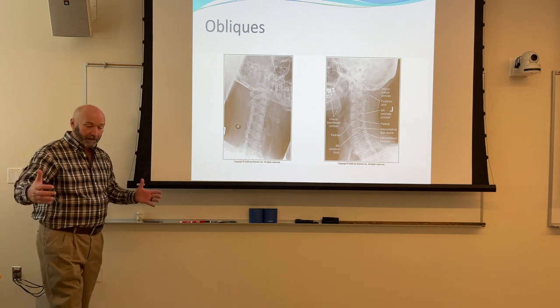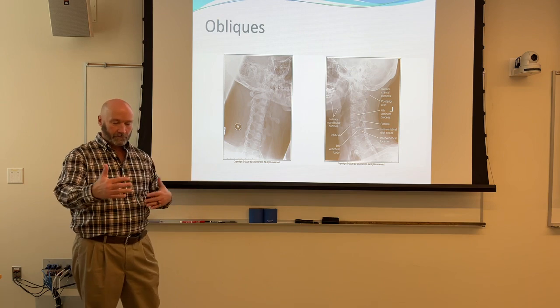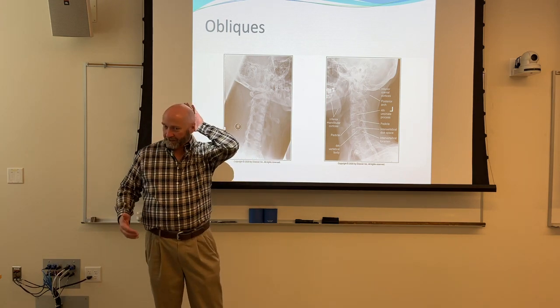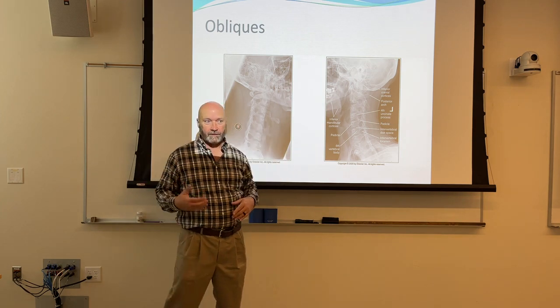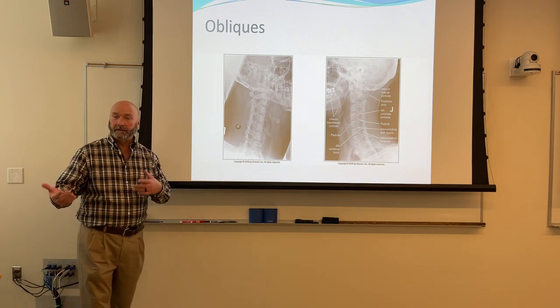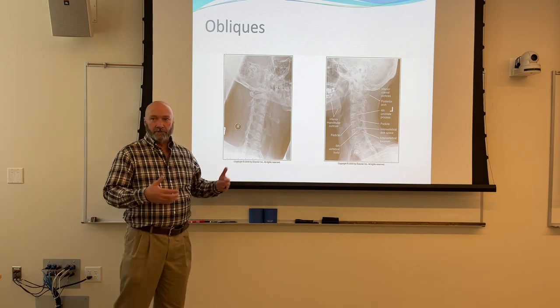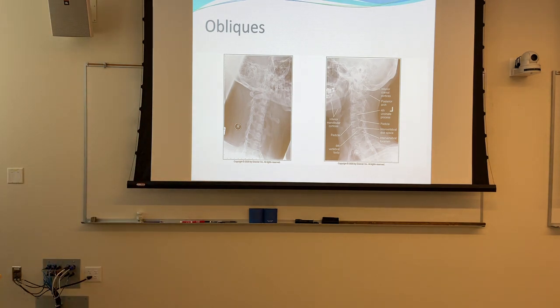Okay. So you got that great big image receptor, so you got a little more room to play. What we used was 10 by 12 films. Date myself. 10 by 12 films, and we had to put the edge of the film right under the patient's head and angle, otherwise you were going to miss it. You were going to project it off the image receptor. Ugly x-rays. You've got virtual grids now to help clean up the scatter. You can't use a grid for that because it's double tube angle. But you've got virtual grid to help clean up the scatter and make it a better looking image than what it used to be.